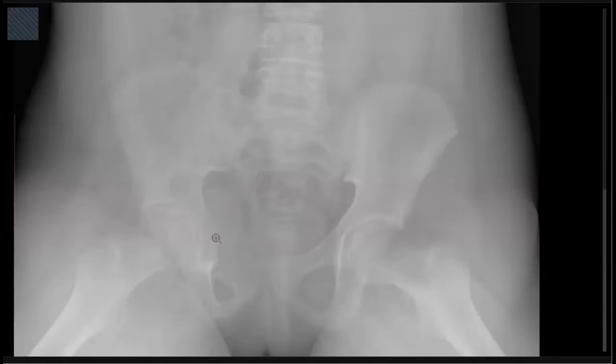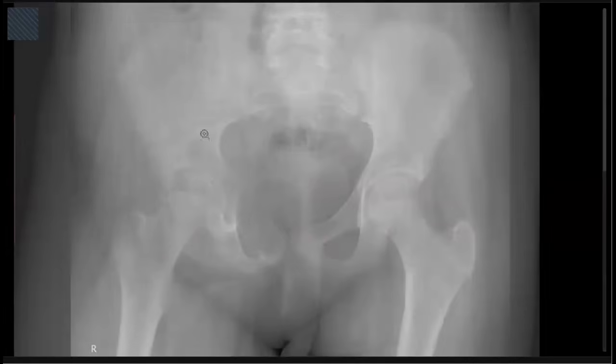No appreciable internal calcification or chondroid matrix. In my routine practice, I will check the other orthogonal view, which confirms the presence of the same lesion. No pathological fractures. The hip joints on both sides appear preserved. No dislocation or sclerosis of the femoral heads.